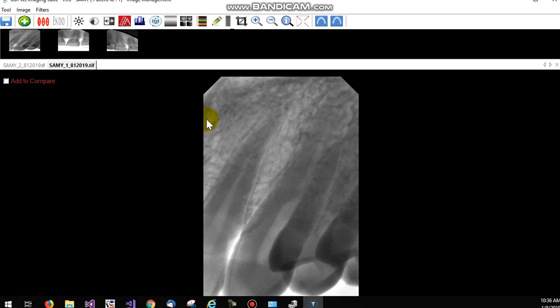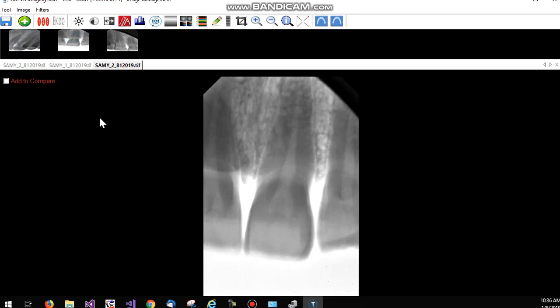So for that, we have the second filter. We have something called the ODI filter, which is specific to the ODI HD dental sensor. This is handy when you wanna enhance the contrast of the image. For that, we'll pull another image that we just captured. We'll just drag and drop, and we will apply the ODI filter. As you see, the quality of the image is changed, and you can apply it as many times as you want to get your desired quality.